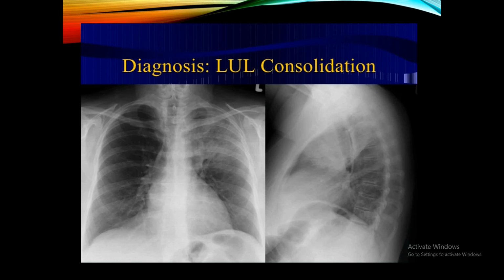In the chest X-ray نلاحظ أنه ال left lung is more opaque than the right lung. أيضا نلاحظ السهم الأحمر يشير إلى tubular translucency تمثل لنا وجود الإيروبرونكوغرام. بعد ما شخصنا أنه we have a patchy opacification، ill-defined opacity in the left lung, we should look for the signs of loss of volume. إذا تلاحظون أنه التراكيا central, mediastinum is central, left diaphragm is not elevated, so we are not having any signs of loss of volume. إذن we are dealing with patchy opacification due to consolidation.